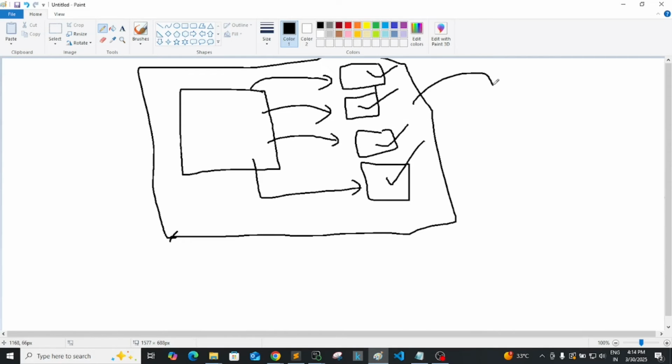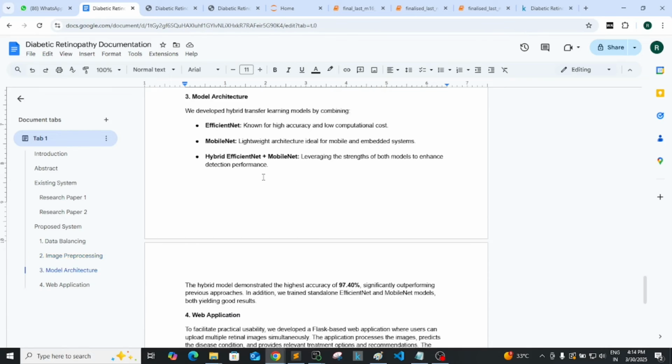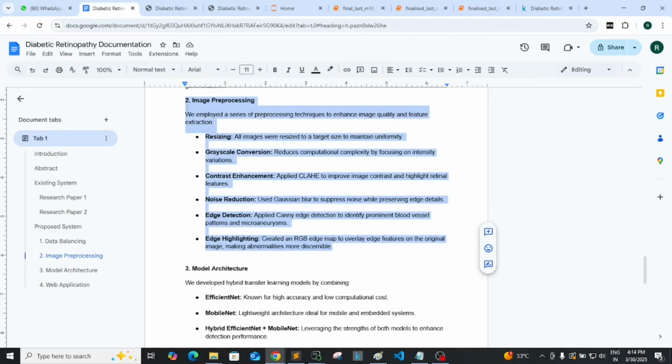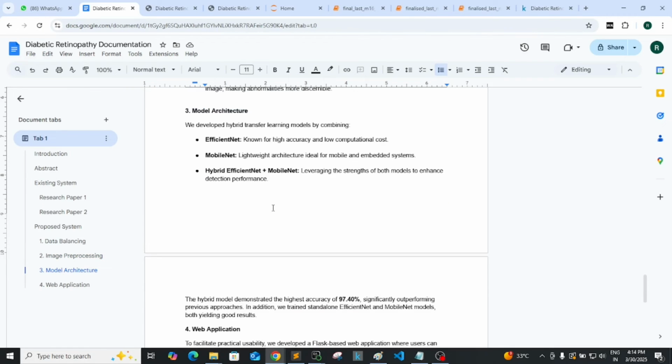After pre-processing and cleaning everything, our images will be of high quality, with the region of interest highlighted and less noise, because we are using noise removal filters, and then edges detected. So our images will now be a completely improved version. After that, here I'm trying to mention those techniques: image processing, whatever things I am doing, but in combination.